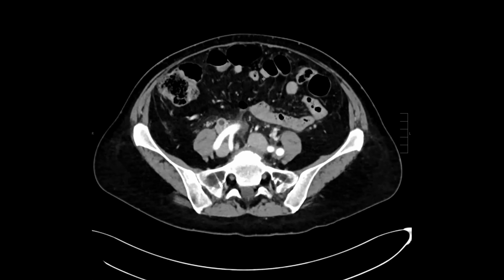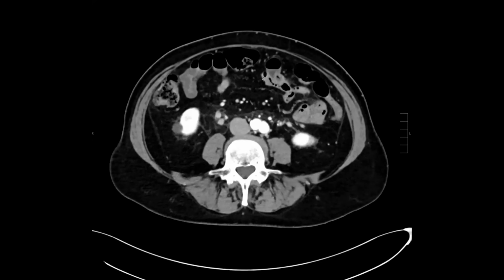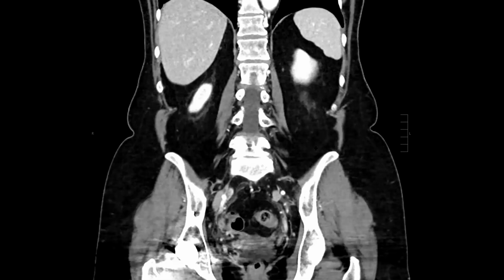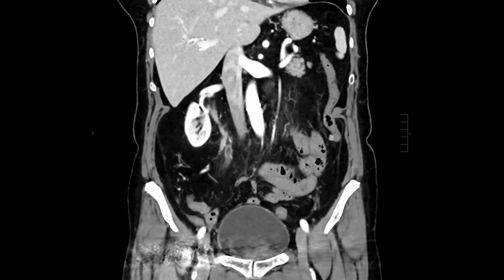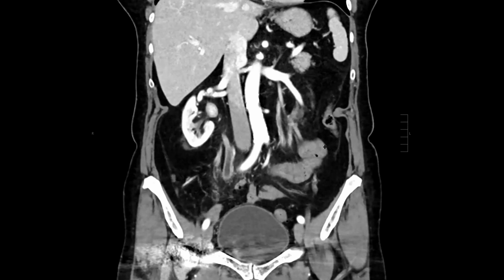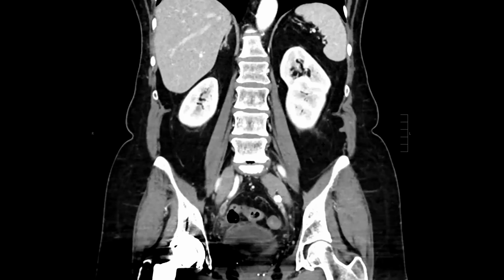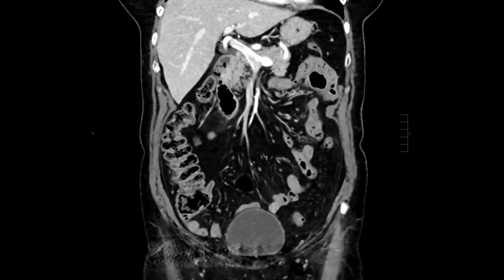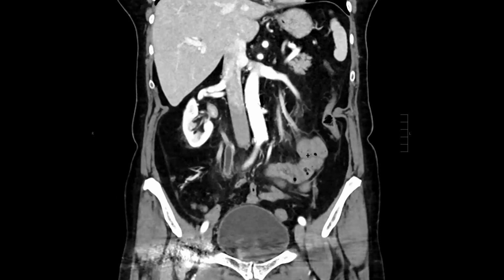Okay, I'll go slower. I think she's saying gonadal vein thrombus because it looks like a dark thing surrounded by a rind, right? But is that not the gonadal vein, or is that the ureter surrounded by a rind? Yeah, that's a great thought. I'm like, this is not the appendix because it goes into the pelvis and it's not really continuous with the cecum. So what's going on with the right-sided collecting system? Where's the ureter? Yes, that's a great question.